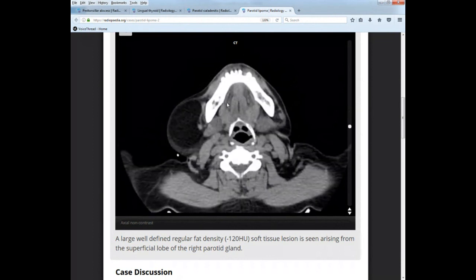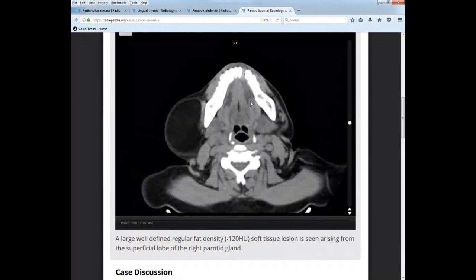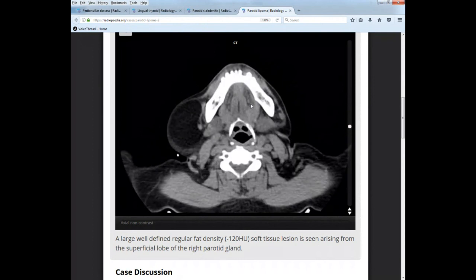See, you can even see it even better on here. It looks almost like your textbook where you have the multiple little ducts that are emptying into, just under the tongue. You can see them. You can follow the track here. So those are your salivary glands. Remember, there's a whole bunch of them, and they each secrete their own chemicals, their own chemical concentrations that perform a very specific function.